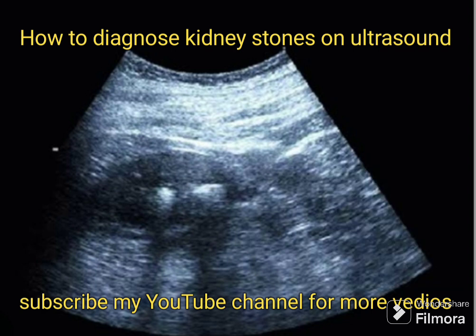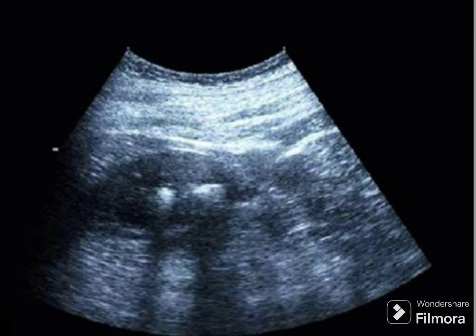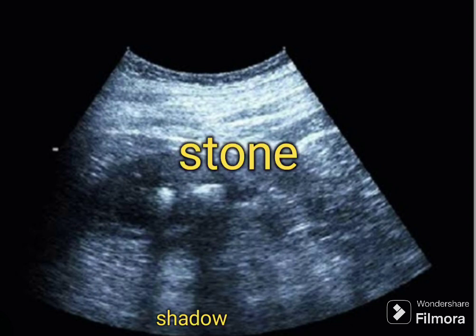In the name of Allah, the most beneficial and the most merciful, today I will talk about kidney stones. What are kidney stones? How can we diagnose them on ultrasound and clinically? What are the types of kidney stones and how does a kidney stone look on ultrasound?